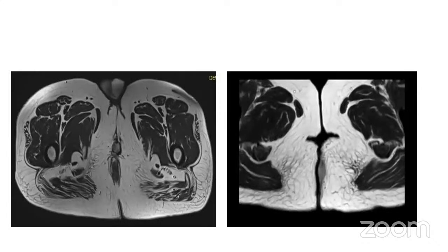So here I'm showing an example. You can see the MRI of two patients, and these are the axial slices. Here you can see the lower limit of the tumor. This is the tumor, and it is adequately surrounded by tissue all around. So in this case, I would not use a bolus. Whereas in this one, you can see a tumor with perianal extension, and you can see a gap around the tumor, and there is no tissue. So in this case, I would prefer to use a bolus, and then I would simulate the patient in frog leg position.